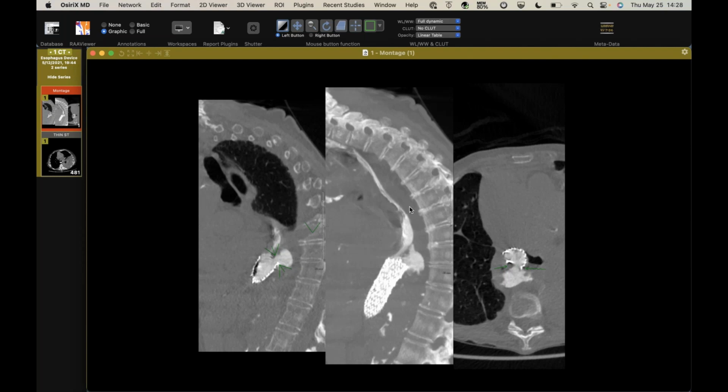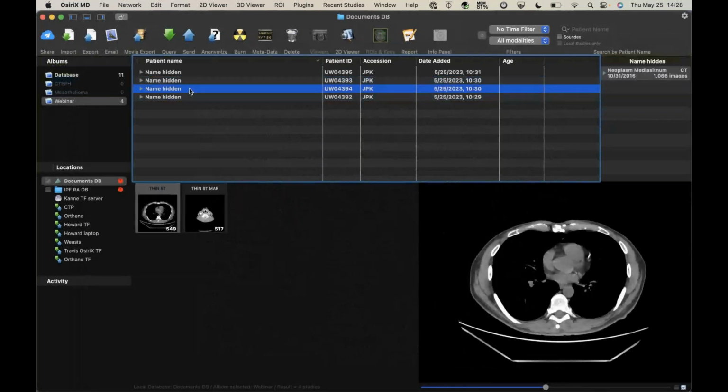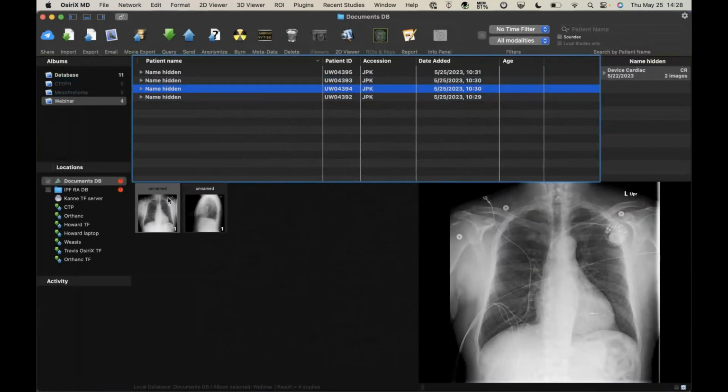and you can make like the old school images by doing stents and all that like that. All right. Good. Let me show this case here. This is relevant to Howard's case.